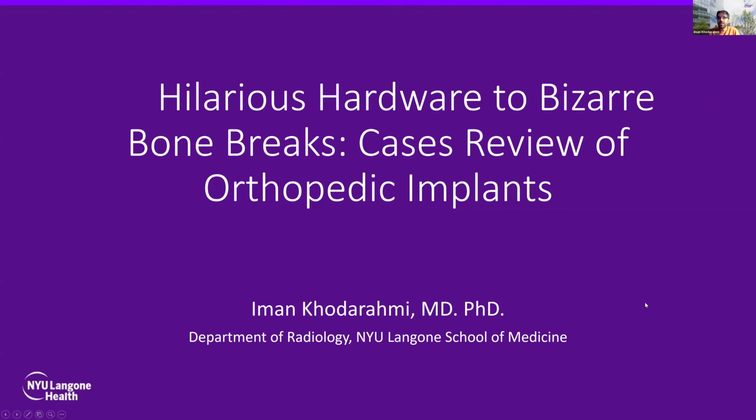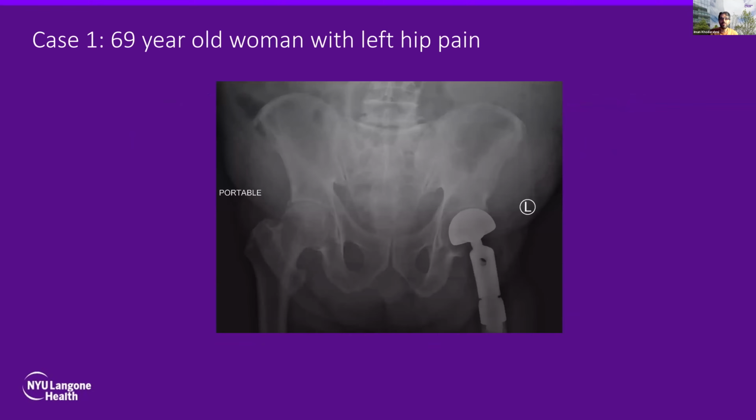So I have a few cases, and after each case, I'm going to give you an explanation of the findings. For each case, I'm going to pause for a few seconds and feel free to think about it. If you'd like, you can put your diagnosis in the chat. If you don't feel like it, that's fine. We'll go over the findings. No disclosures. So this is the first case. I'm going to give you 30 seconds to think about it.